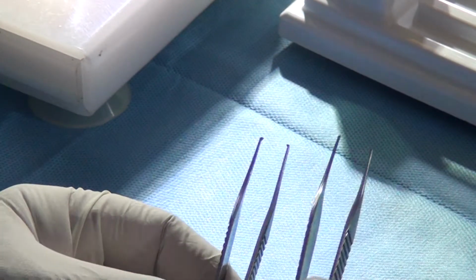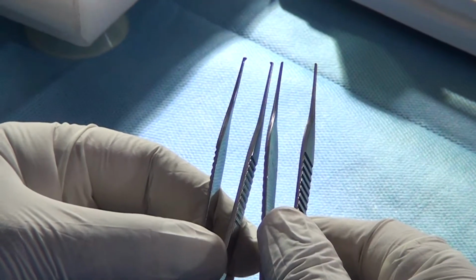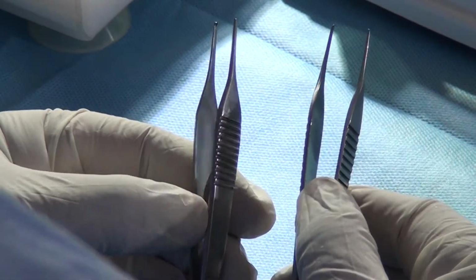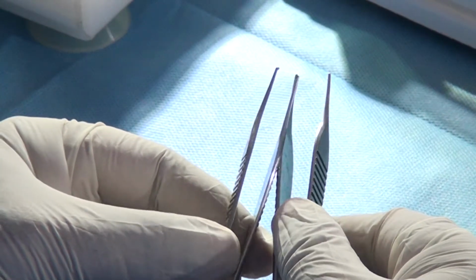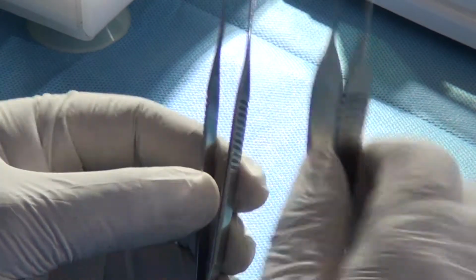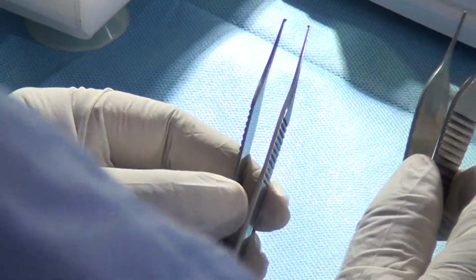Now, these are the two forceps you can see. Can you see them? I want to hear yes or no. Yes. You better be alive and awake and kicking. Speak loudly so that I know. I'm looking here, so I don't know who has not heard it. Then you'll get up to ask me a question. There is a tooth here. There is no tooth here. It's a plain forceps. This is a tooth forceps. There are only two types of forceps. Don't get into their names. Plain forceps and tooth forceps.